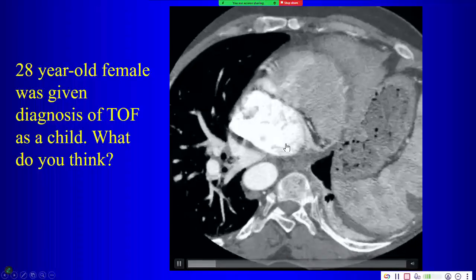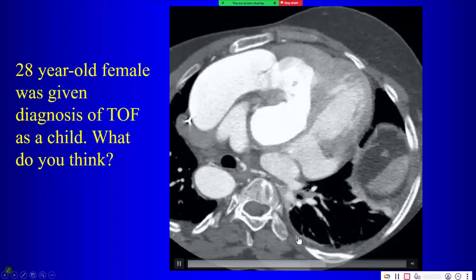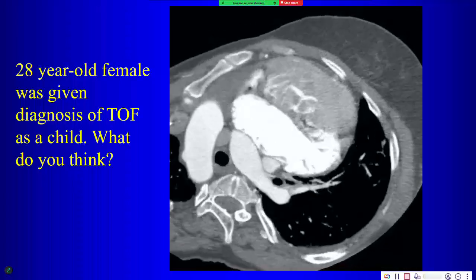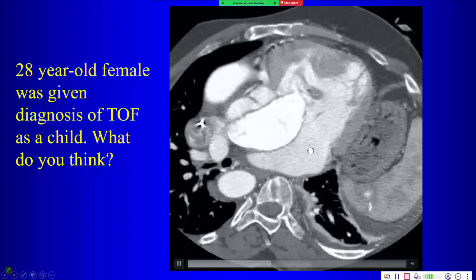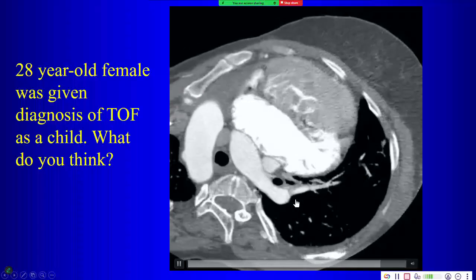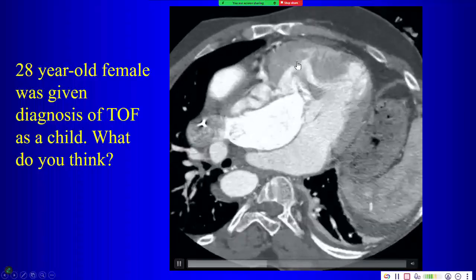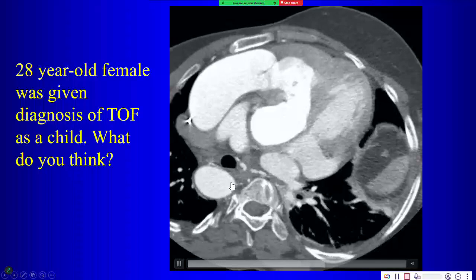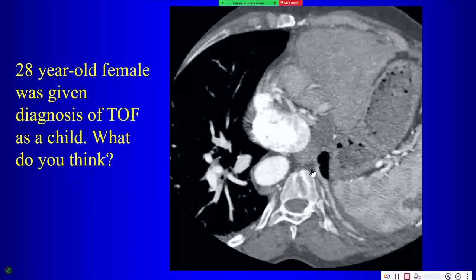Well, again, we start from the bottom, right? And the IVC will take you to what? Right, so that takes you to the right atrium. So this guy is, that will be the left atrium, right? So now we want to look for the ventricles, right? So over here, that guy you think, RV, okay, so let's go through that again, right?